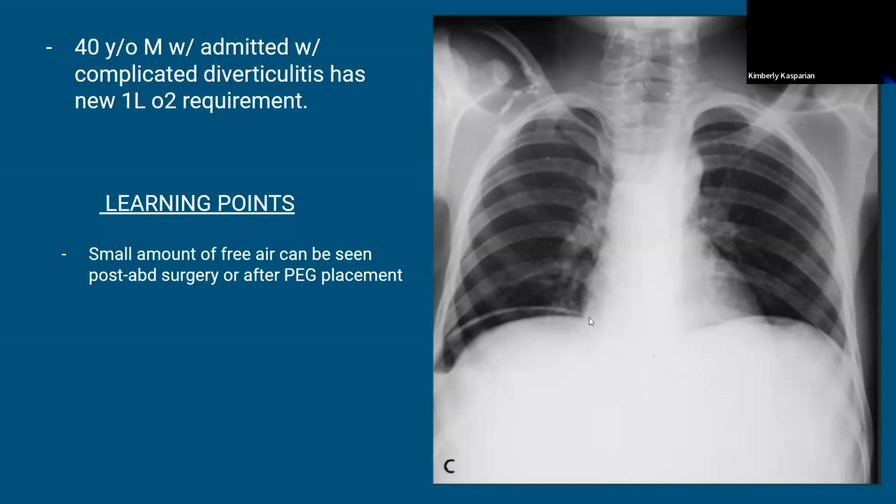That's when it comes to a clinical decision: is their abdomen exam worsening, or is this just a post-op? There's a little bit of air in there. There's nothing like a bowel perf or something catastrophic that happened. So just be aware of that, because I've seen that on a ton of post-PEG x-rays.